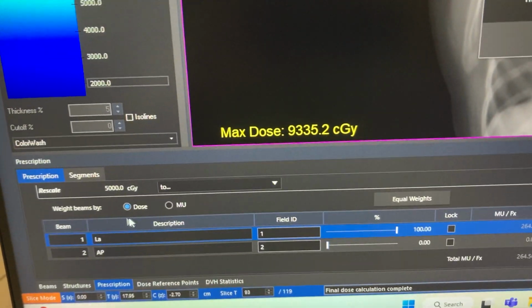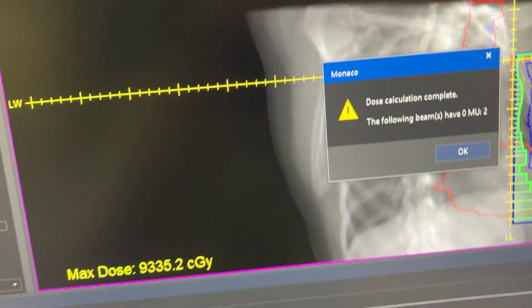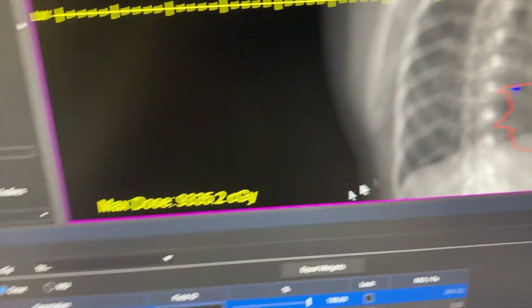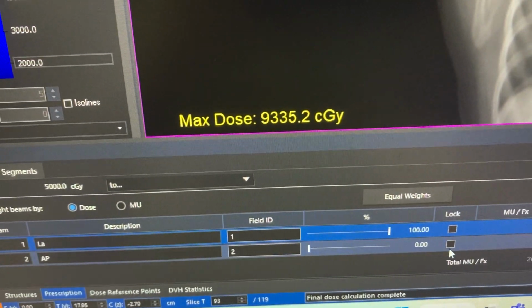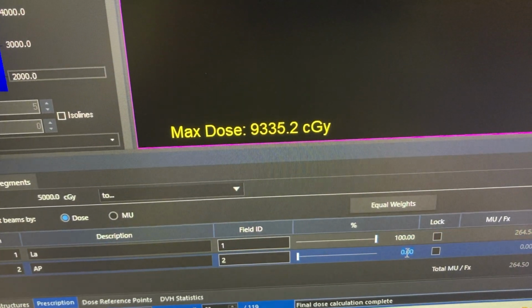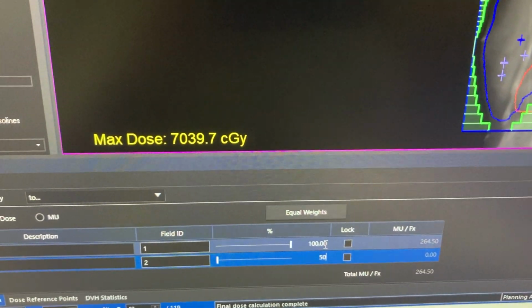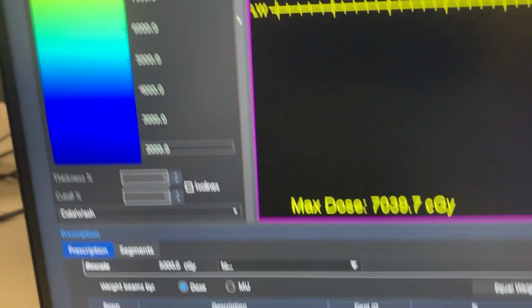Okay, now I come to the, I need to set this. That is such a big mistake. 50%. Okay, now this is good, this is awesome.